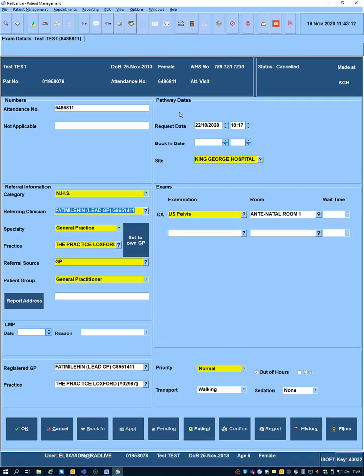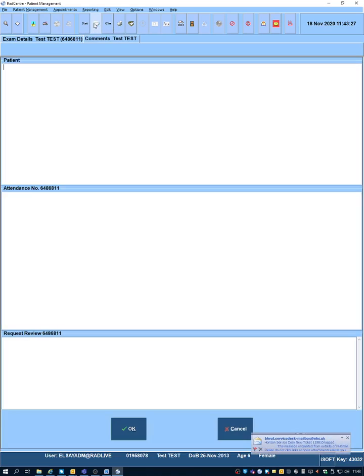So we double click on this. On the top here, you will have multiple icons. There's one grade here, which is next to start. As you hover, it will show you what this icon does. It says comments. So when you press on this comments, this will allow you to add your decision.